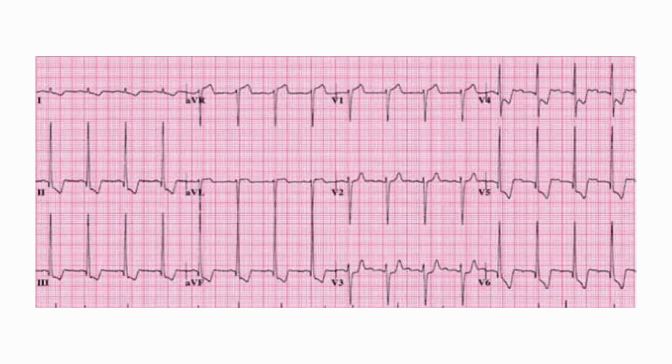This is a 14-year-old guy who's come in with collapse, and what you see is sharp dagger-like Q waves, and what you also see in addition is kind of a left ventricular hypertrophy. So whenever you come across a syncopal patient with LVH and sharp Q waves, think about HOCM, and please do not label these ECGs as a left ventricular hypertrophy. This is hypertrophic obstructive cardiomyopathy.